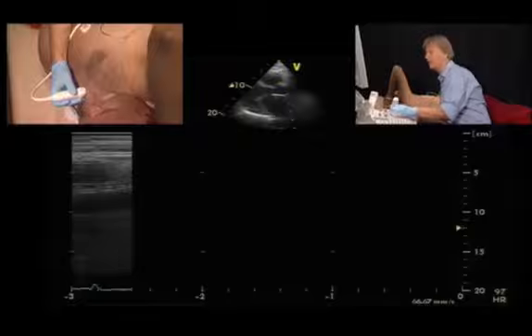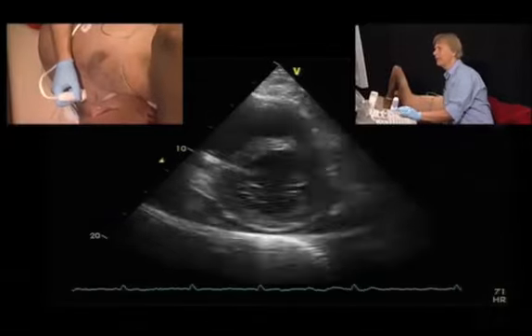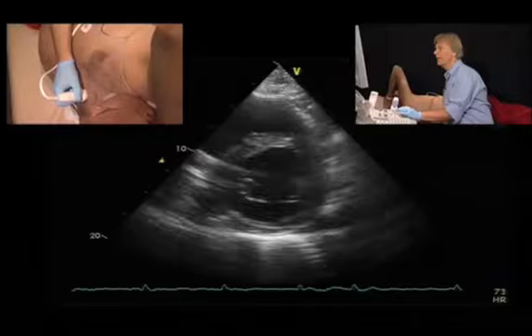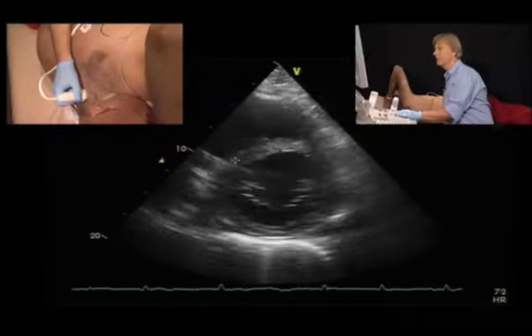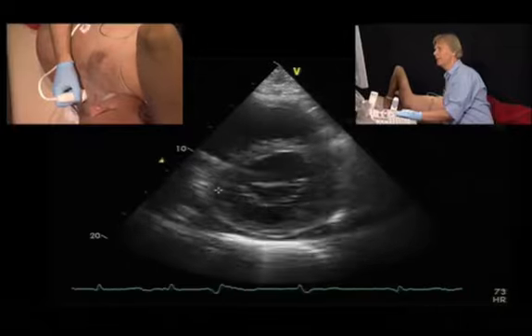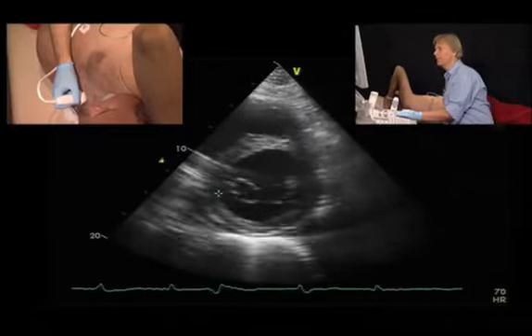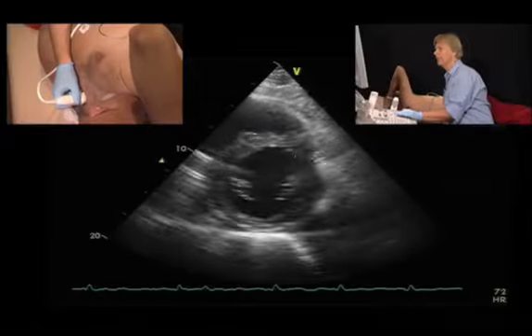This also correlates with a reduction in left ventricular function. If we take a look at the short axis view, you can see that there is global dysfunction, but certain regions seem to be even more hypocontractile: the septum here, and then probably also the inferior septum, and maybe also the anterior wall.